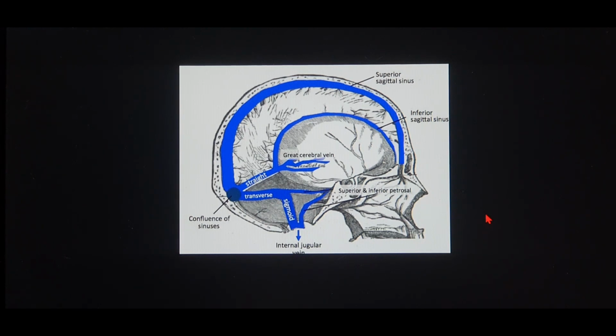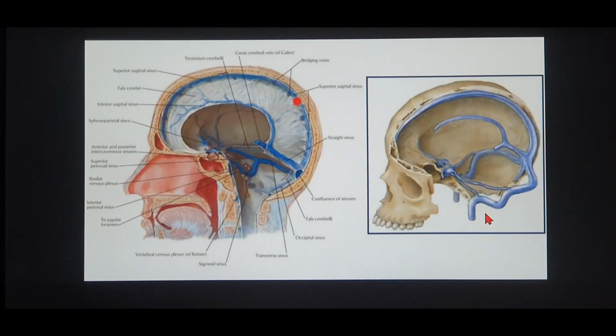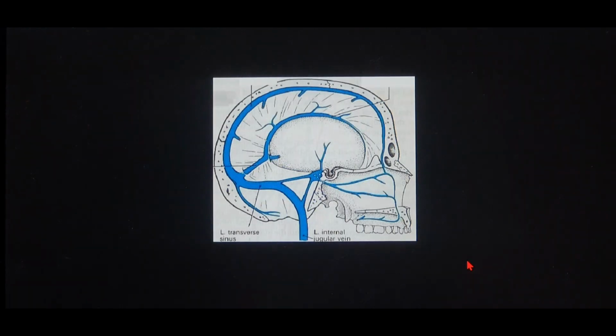Today I'll be talking a lot about the MRI scans. I'll be reading the MRI brain and the MRI paranasal sinus, that's the MRI PNS. I'll also be talking about what questions the examiner may ask for an exam-going student, for a postgraduate or in MBBS, if they ask a lot of questions about MRI scans like spotters, what questions do they exactly ask and where you need to be very efficient in answering.